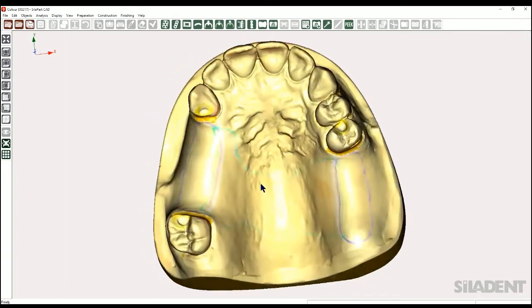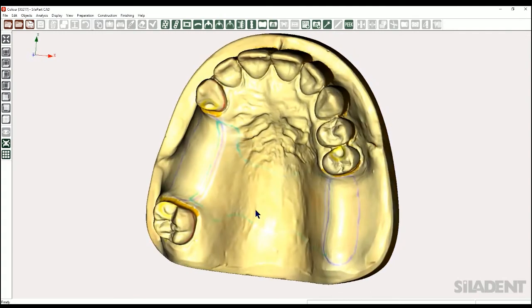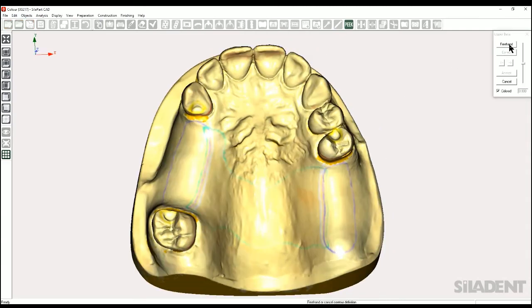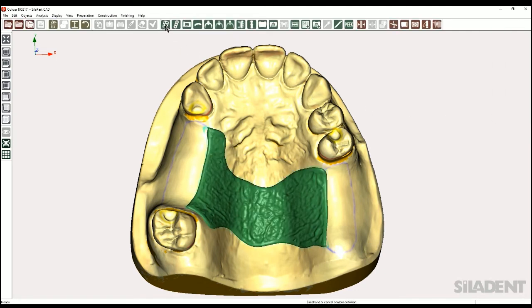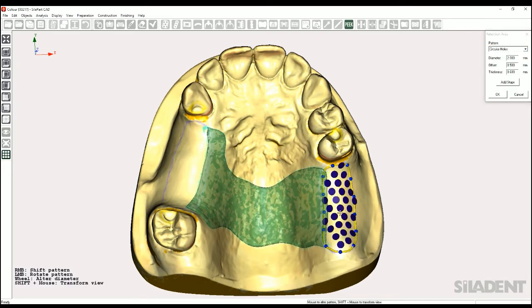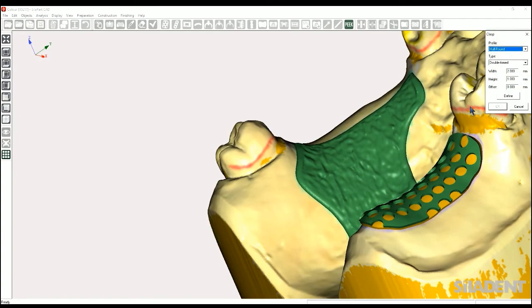In this function, the individual design groups receive uniform colors, red for the clasps, blue for the retention, and so on. With this function, the software can automatically recognize the individual elements and separate them from other design parts. This is done again by color analysis in the middle of the mouse cursor. Based on the different colors of the design lines, the SilaPart software generates the full partial with only one click on the mouse wheel. With this innovative one-click technology, the partial framework can be designed in just a few minutes.